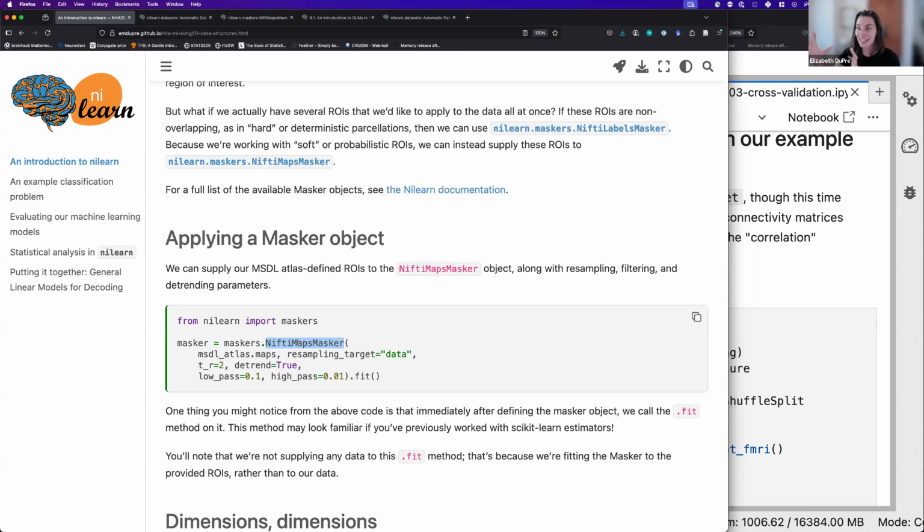Commonly, particularly if we're taking atlases that are published in the field and just applying them to our data sets, people may or may not realize that the coverage doesn't always totally overlap between the atlas definition and your particular brain volume. We try and account for this as best we can in terms of the resampling, but sometimes the data just isn't there.